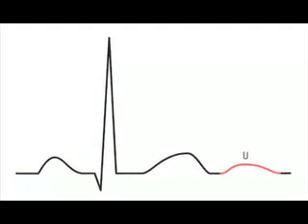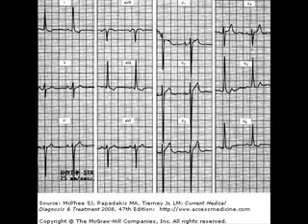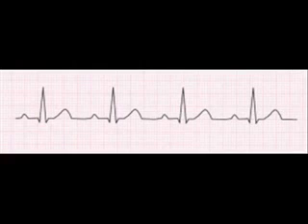Now let us see another, calcium abnormalities. Whenever calcium increases in the blood, cardiac contraction increases and there will be narrow QRS complexes. That means the ventricles, they contract very fast. You can see here very narrow, very narrow, like sharp lines. This is characteristic of hypercalcemia, high calcium level. In hypocalcemia you will see the reverse, increased complex levels.